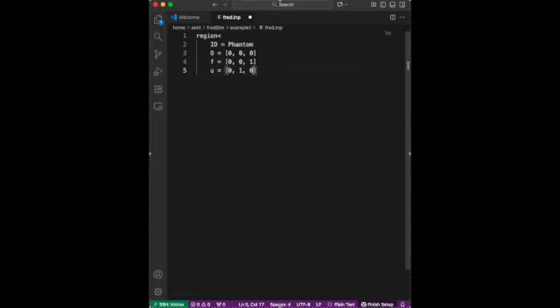In that case, we have to define which side is up. Once we know which side is up and the forward vector, the perpendicular to them will be our left or right vector, the vector in the x direction. So by defining these two vectors, the code automatically knows the third vector.